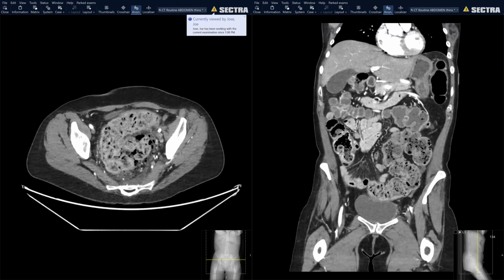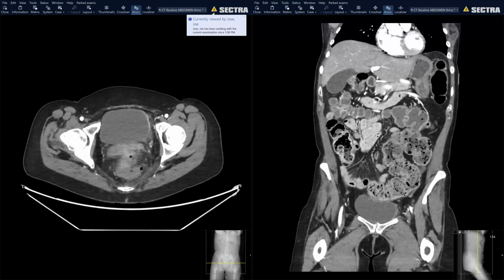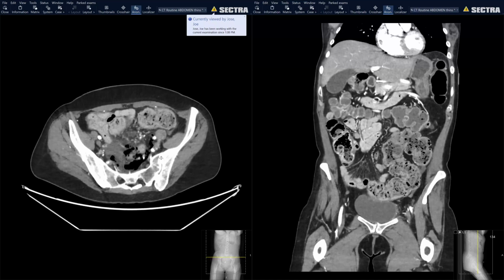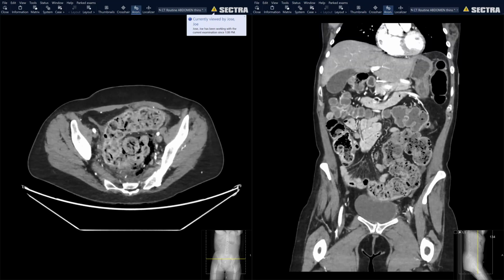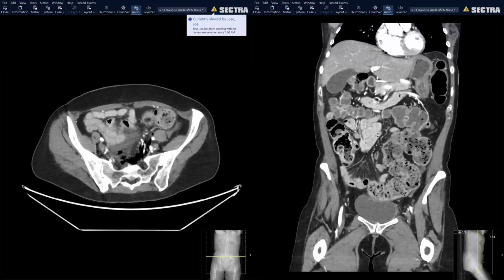Yeah, that was it. This was stercoral perforation. So there was no diverticular disease or anything, but post-op, it was all ischemic and necrotic. And there was, as we said, free air and fecal material. So yeah, this was stercoral perforation.